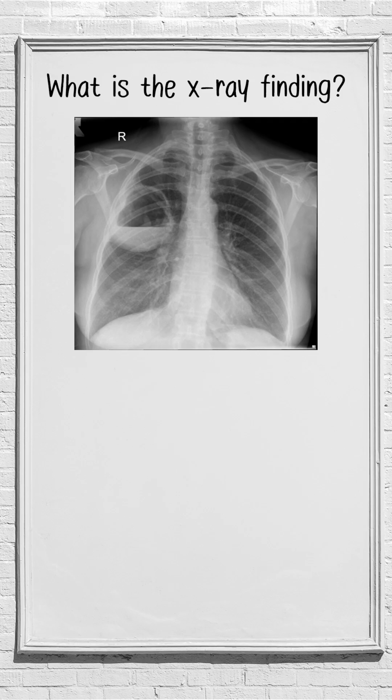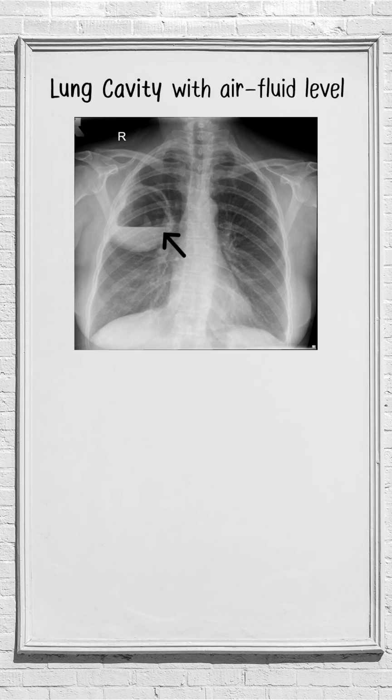What is the finding in this chest X-ray? There is a cavity in the right middle zone with an air fluid level within it.